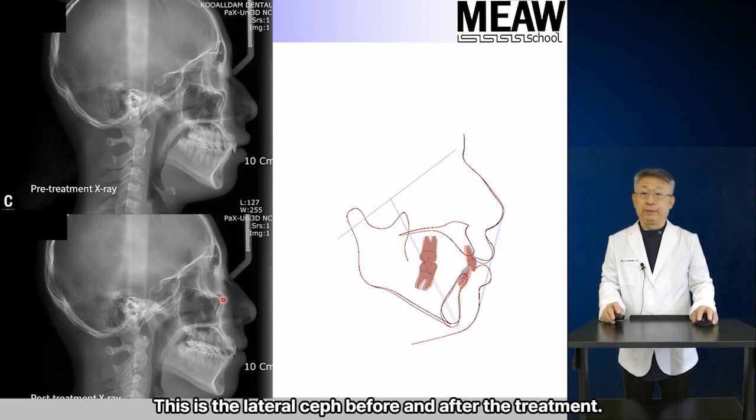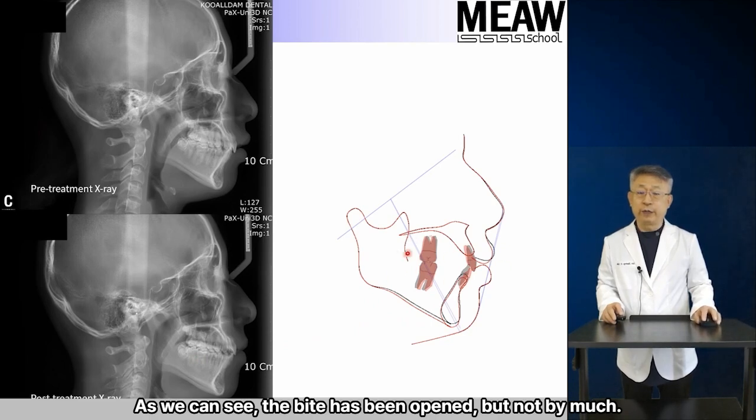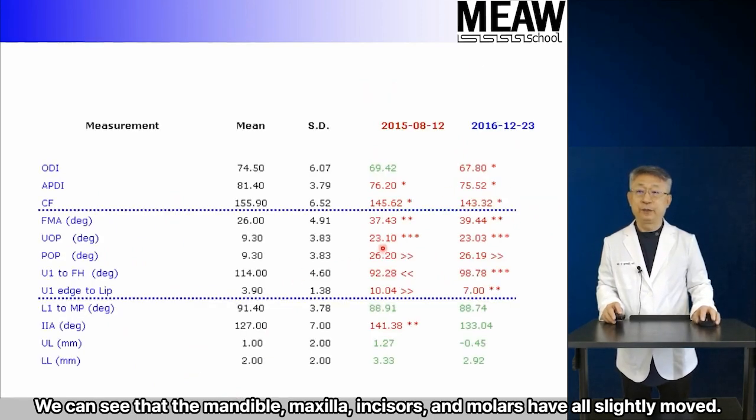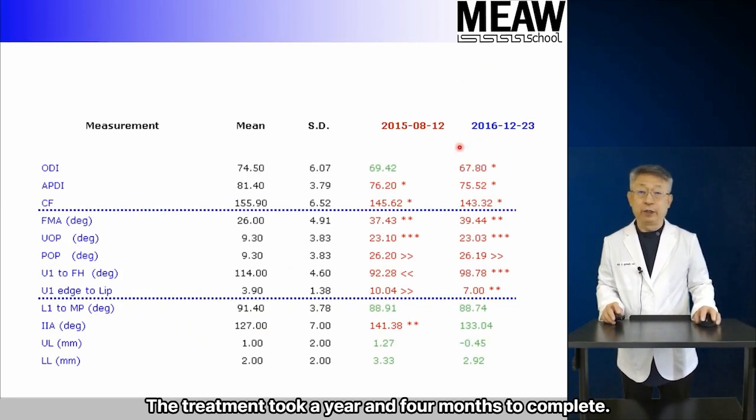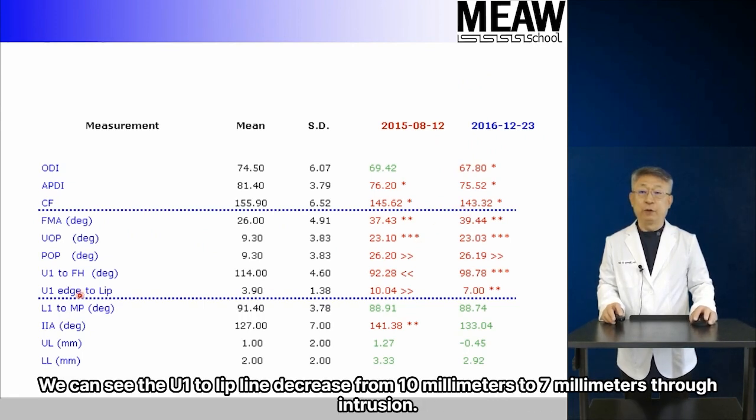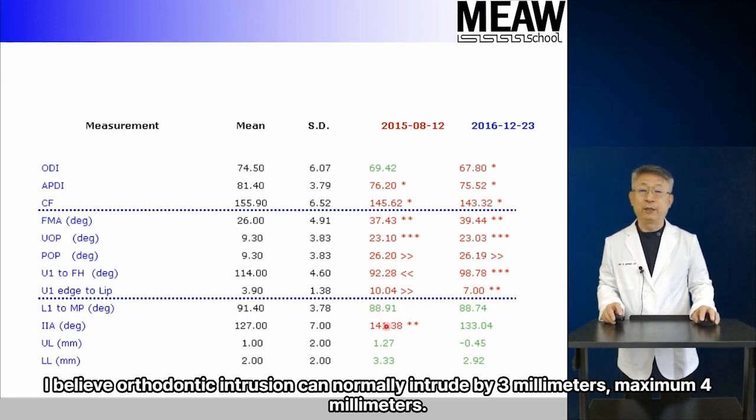This is the lateral ceph before and after the treatment. As we can see, the bite has been opened, but not by much. We can see that the mandible, maxilla, incisors, and molars have all slightly moved. The treatment took 1 year and 4 months to complete. An important thing to note is that the combination factor never changes. We can see the U1 to lip line decrease from 10 mm to 7 mm through intrusion. I believe orthodontic intrusion can normally intrude by 3 mm, maximum 4 mm.